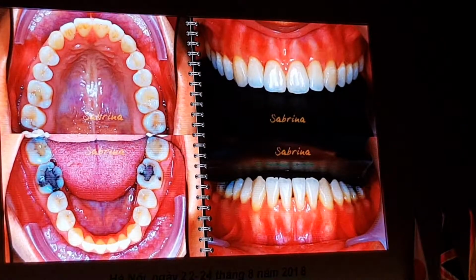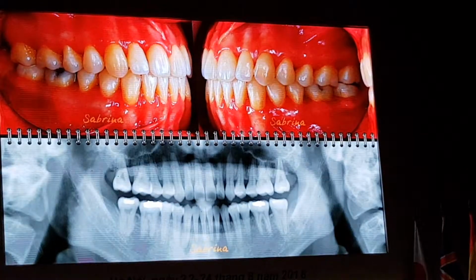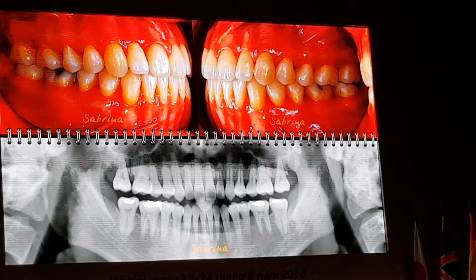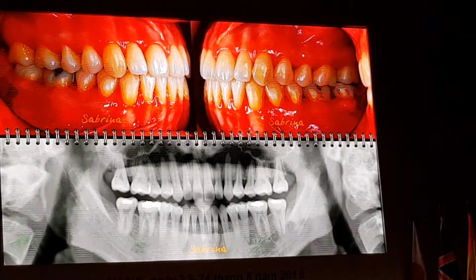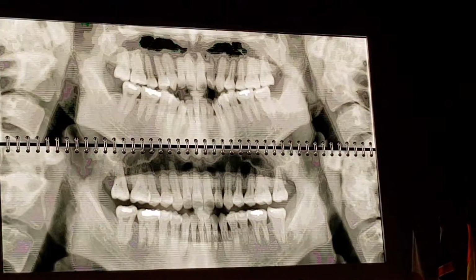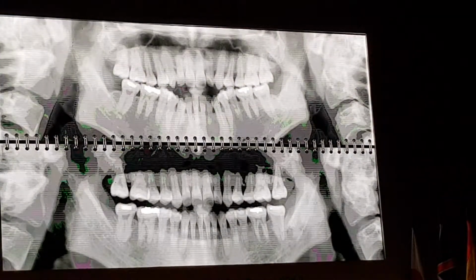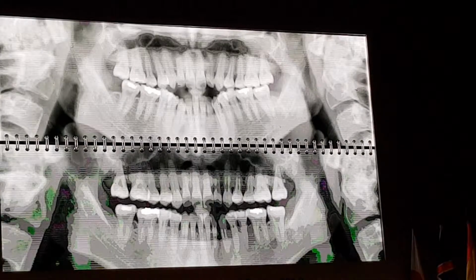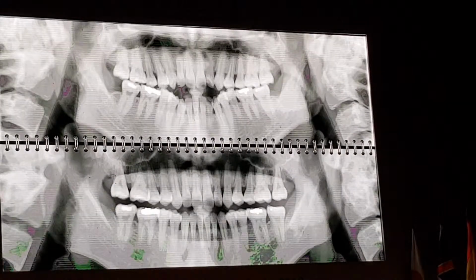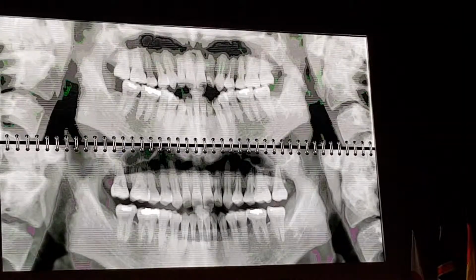Here's the occlusal view and buccal interdigitation. The patient extraoral view and smile. And you can see with the class 3 elastics, we can very effectively tip back the lower molar. You can correct this kind of open bite by class 3 without any mini screws.